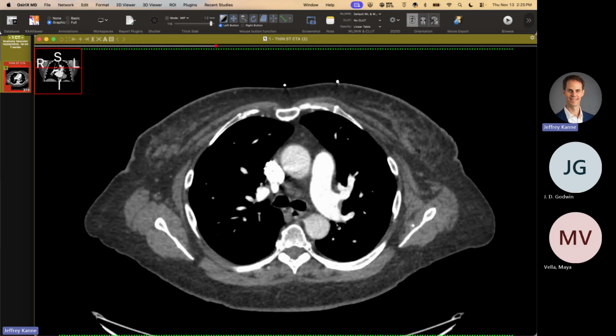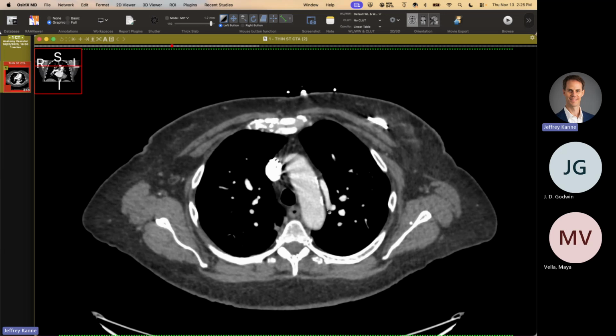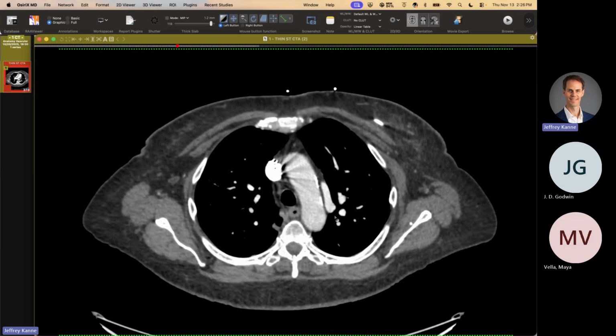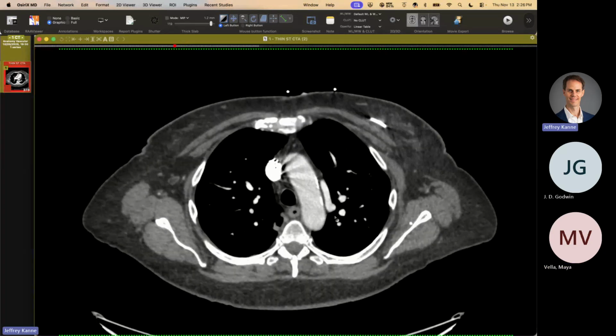But we also have a superior pulmonary vein. So this is just draining the apical posterior segment. And I don't think I've ever seen a partial anomalous pulmonary venous return. I couldn't come up with a better name. So it's PPABVR. Love it. That's great. I don't know if you've ever seen this before. It's just kind of a cute finding. No, I haven't. Okay. I like it.